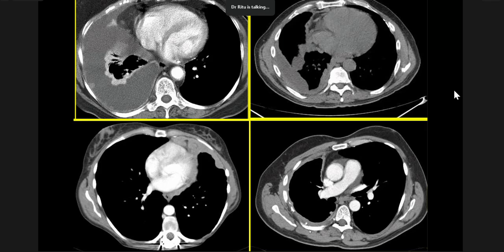So sometimes as time passes, the rind doesn't seem to be getting much thicker, but you will see that the chest itself is shrinking. And so if you compare the right side to the left side, you can see that this is very, very much contracted on the right side. Even though the tumor doesn't seem to be very bulky, the tumor here seems to be much bulkier than in this patient. So anytime they have this contracted appearance of the chest, this means that the tumor has infiltrated into the intercostal spaces and has caused desmoplastic reaction or contraction. Anytime this happens, this tumor will not be resectable.